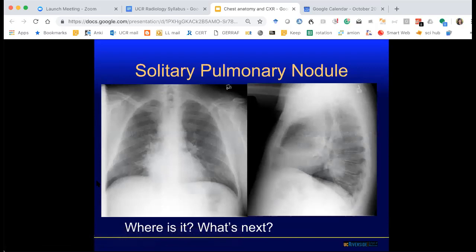Posterior, closer to the spine. Okay, so we think there's something here. What about on the right side? On the frontal, where do you see it? That abnormality. Can you co-localize it? It's the right heart border. Yeah, over here. So this is in the right side.